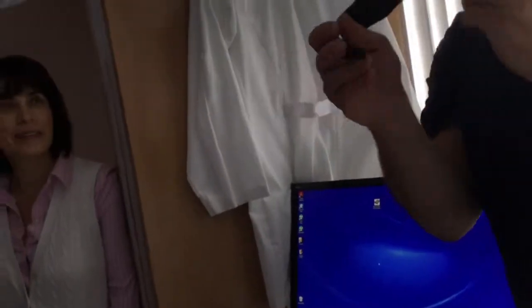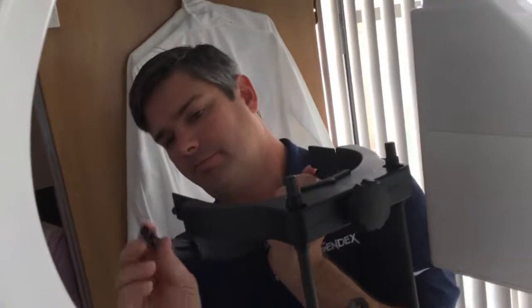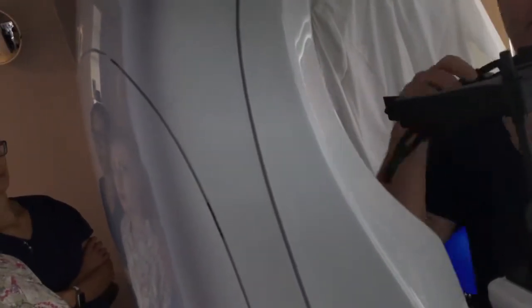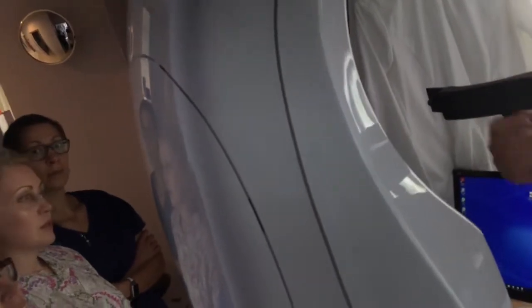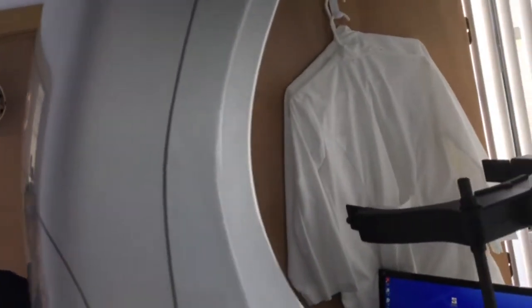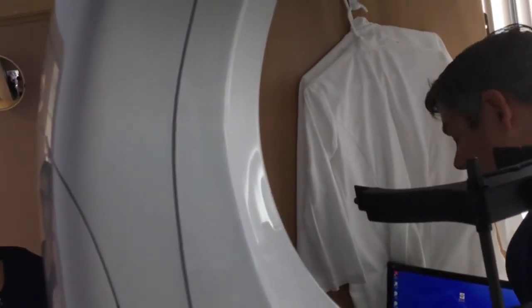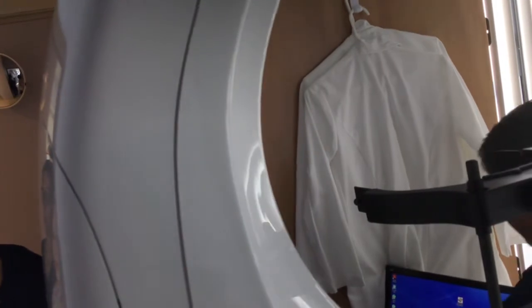There is one strap that comes over the back here too. For a cone beam, if you want, you can add this additional strap. Some people do it, some don't. It just snaps into place on here. You can do it on both sides. You can just leave it flipped up if you want, but when they're in there, you can tighten the back of their head to stabilize them more. Some people use it if somebody is real shaky. Movement really hurts a cone beam, so you want to make sure they're as stable as possible on the cone beam side of it.